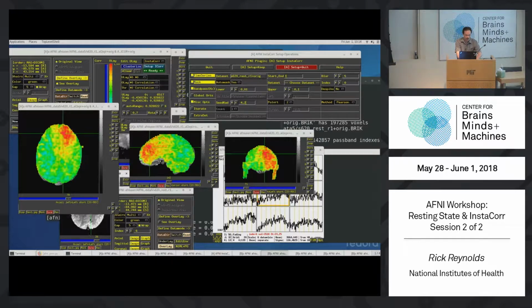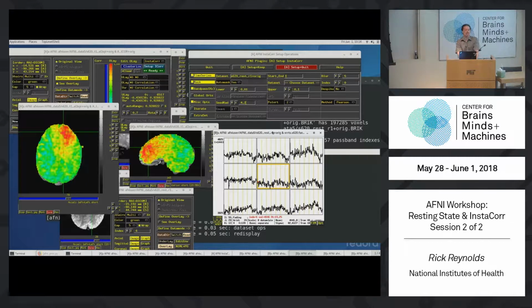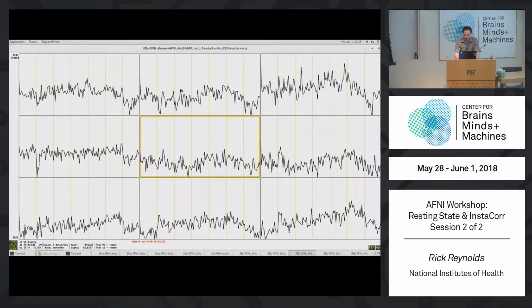What does the EPI data look like there? So we're in this location. What does the EPI time series look like? I don't know, looks fine, right? I don't see any particular strangeness there. Why would we get such a correlation? You might actually be able to see, you don't have to do this again, but let's see if we find anything.